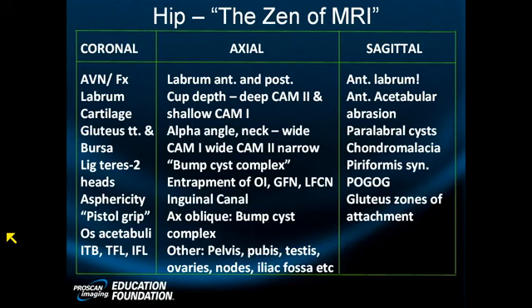She has a normal tapered neck. She has not a single supportive sign of a labral tear. Only 5 or 6 of which I've mentioned. We're going to hit them all. So no primary signs and certainly no secondary signs. That's how you differentiate a sulcus from a tear. It's round, it's smooth, it's curved, it's symmetric. It may deepen as you go down, no secondary signs, and we have another cause for the patient's problem. So why give them two diseases? So a little bit of common sense, a little bit of morphology, and a lot of knowledge.